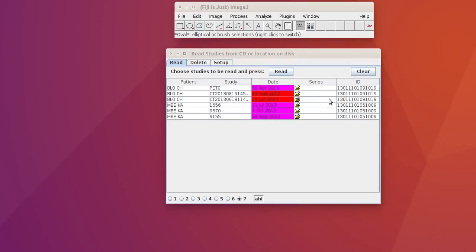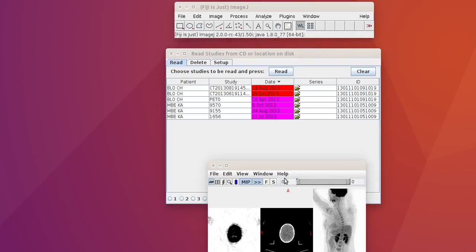This is a demo to show the use of presets in follow-up studies. First I order the studies in date reverse form, and I start to bring in the first study. Here I'll fast forward. Okay, here's the study.